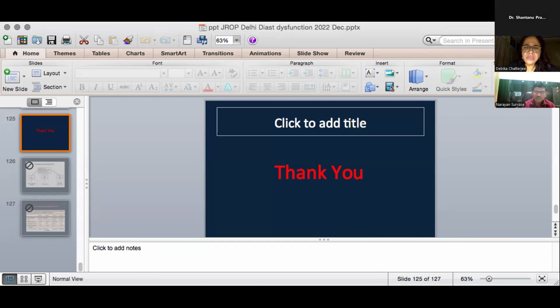These are done routinely, and also you can look at the isovolumic relaxation time. It helps you when you are not getting all the criteria clearly, and you are in a position where you cannot classify. So use these additional parameters. They serve as corroborative evidence rather than for grading diastolic dysfunction.